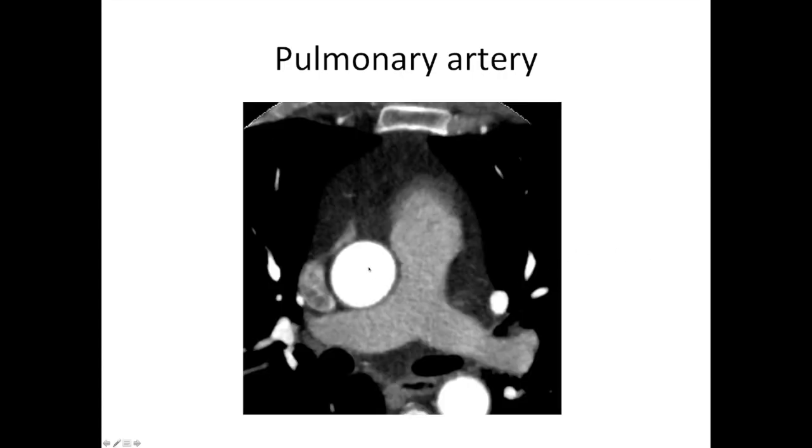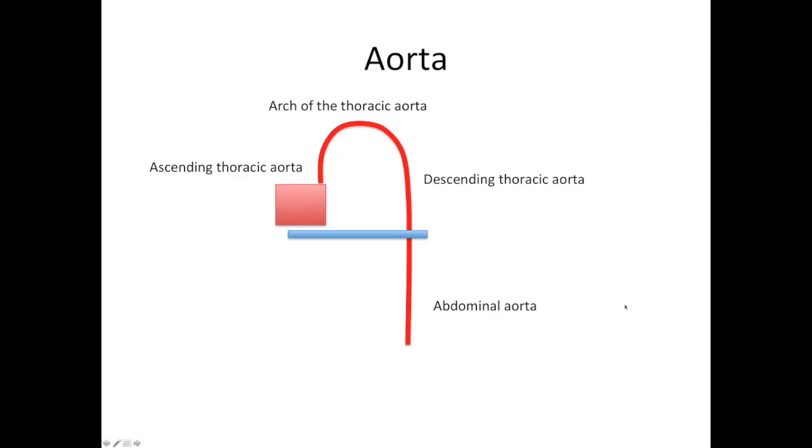So here again, we've got the aorta, the ascending aorta here, and this is the pulmonary valve. You can almost see it just in there, and this is the main pulmonary artery. It branches to give the right and left pulmonary arteries here. So we've got main pulmonary artery, pulmonary trunk, and the right and left main pulmonary artery branches.